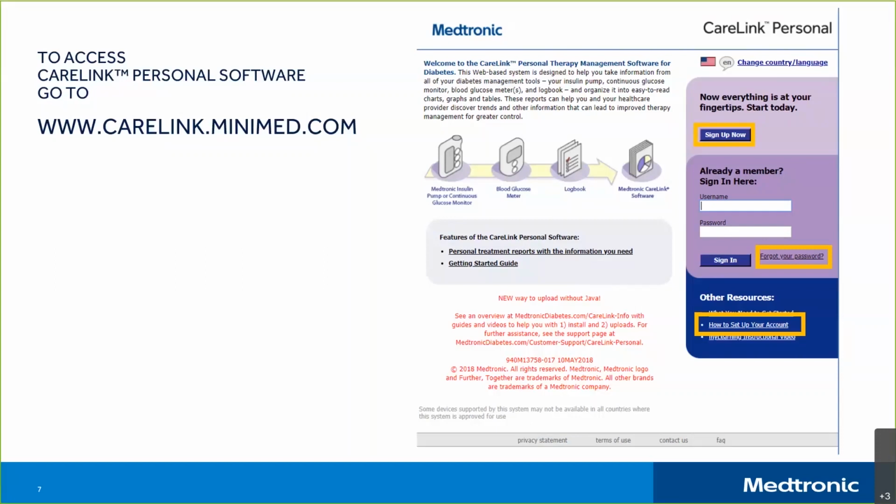From our previous sessions, some people had asked about what to do if you forget your password. If you forget your password, click Forgot Your Password. Most of the time, the Forgot Password email is then delivered to you within a few minutes of the request. Sometimes it will take a bit longer, but not more than a couple of hours.